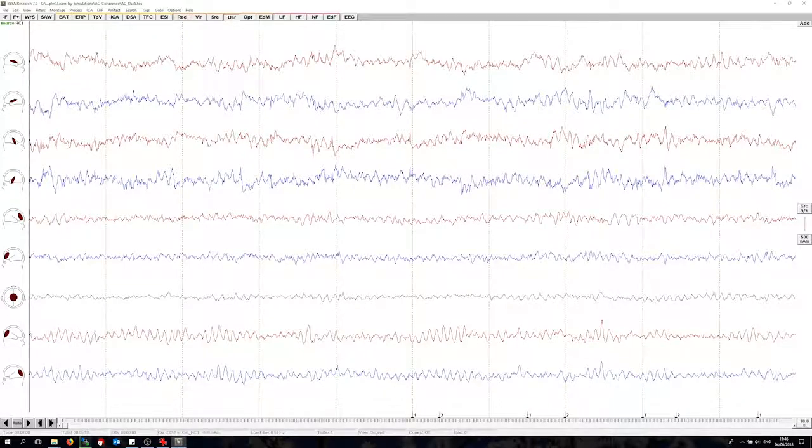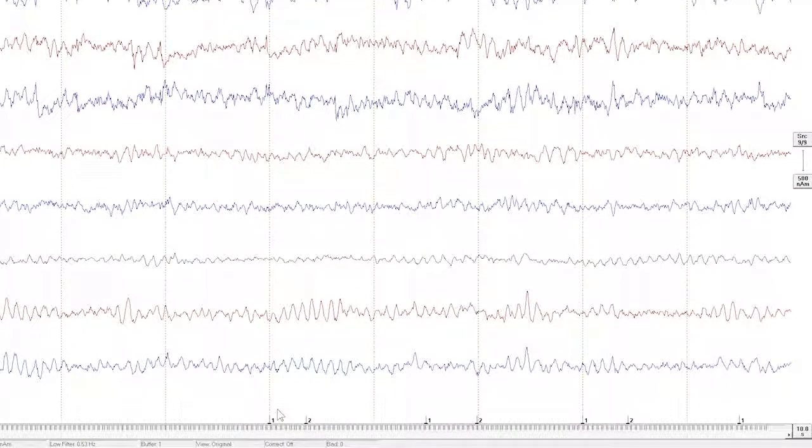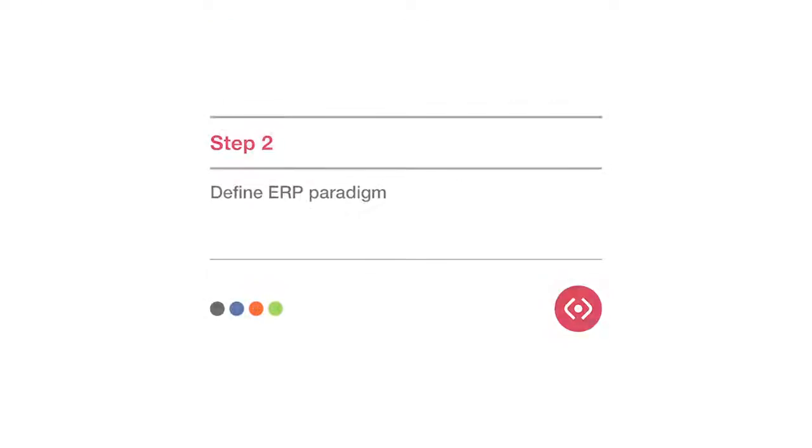You can see the stimulus events at the bottom. Trigger code 1 denotes the onset of an evoked auditory activation, which is followed by the simulated oscillatory activity at varying intervals. The activity was simulated with a low signal-to-noise ratio and is thus not apparent in the non-averaged data.